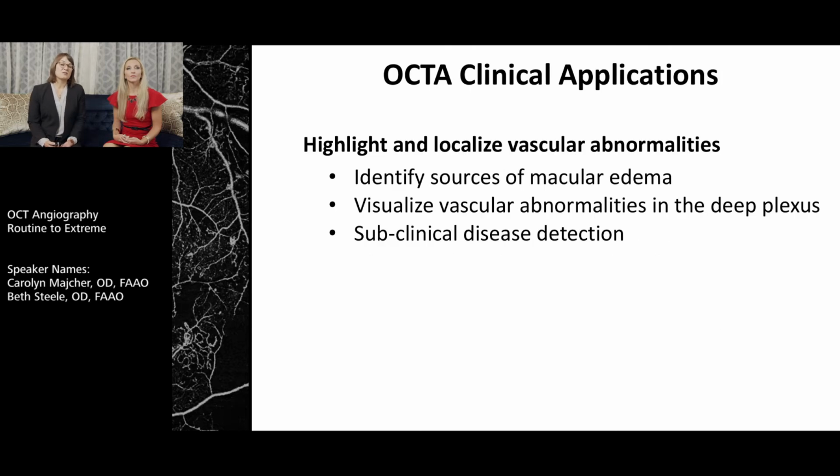Another really interesting part of OCT angiography, and something that I'm really excited about, is that we're understanding disease processes in a totally different way because of this technology. And this concept can be applied to conventional OCT as well. 15 years ago, before we understood the stages of a macular hole, for example, the same type of concept is being applied with angiography, where we're learning new things about the vascular pathogenesis of conditions that we haven't known before. And this leads to very strong potential in clinical applications as the technology and understanding advances.